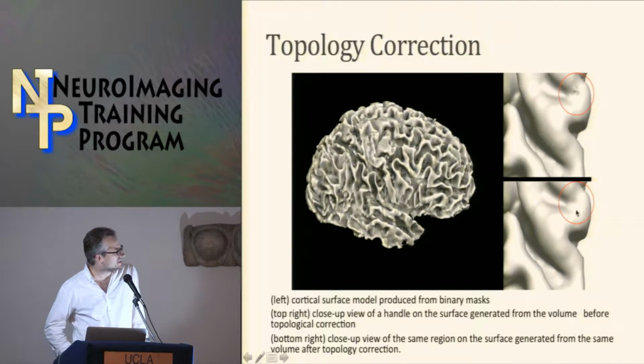What this does is ensure that we can describe the surface of the brain using two-dimensional coordinates because it is topologically equivalent to a sphere. This becomes important when we're doing mapping because it means we can have a consistent coordinate system between one brain and another, and we just need to compute the transformation from one surface to the other.